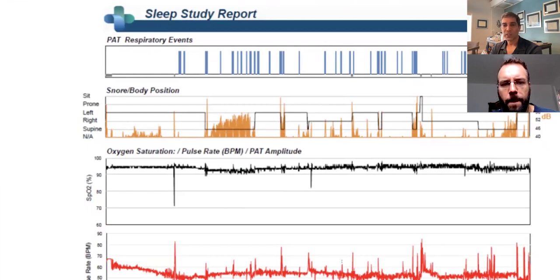And once again, the pulse rate is volatile during the periods. But it's interesting that it wasn't volatile during this period of snoring. Isn't that interesting? In this period it was very volatile, and in this period it wasn't. It was initially, and then it stopped becoming volatile.